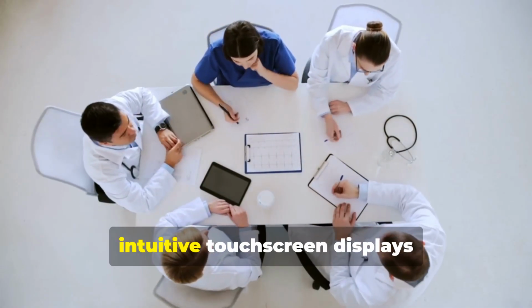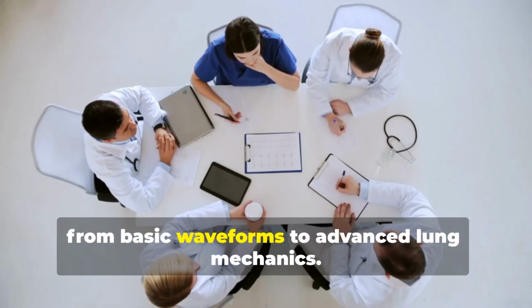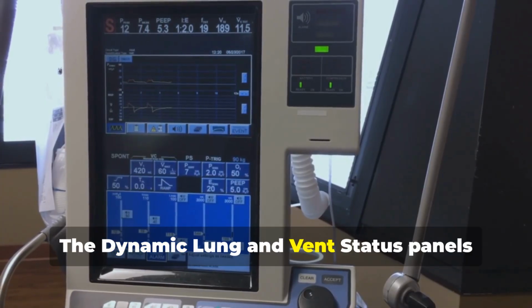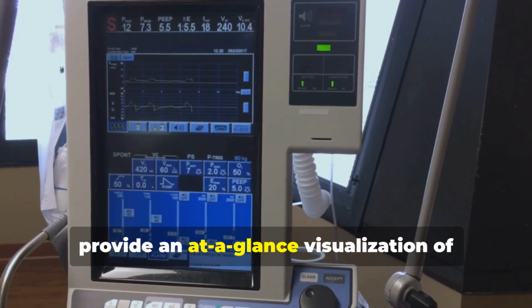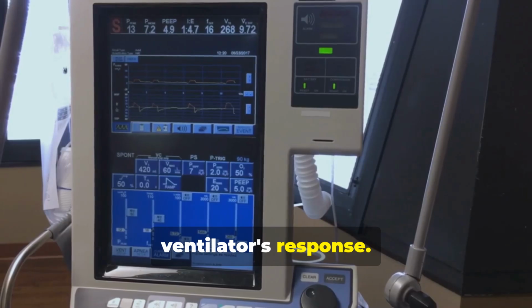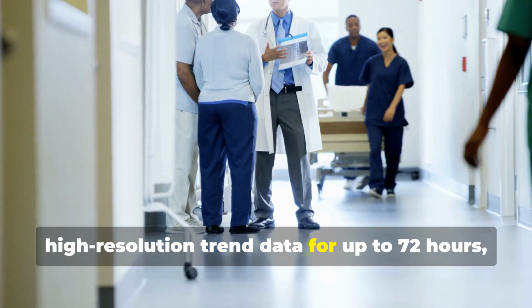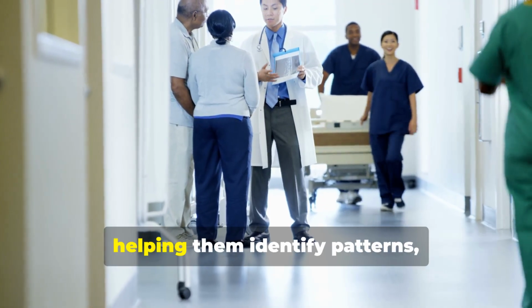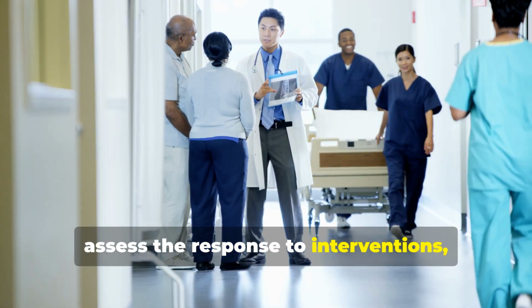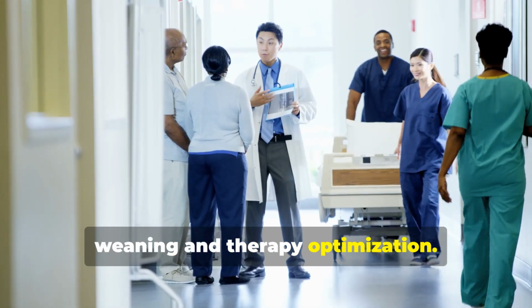The large, intuitive touchscreen displays comprehensive monitoring data, from basic waveforms to advanced lung mechanics. The dynamic lung and vent status panels provide an at-a-glance visualization of the patient's condition and the ventilator's response. Clinicians can easily review high-resolution trend data for up to 72 hours, helping them identify patterns, assess the response to interventions, and make more informed decisions about weaning and therapy optimization.